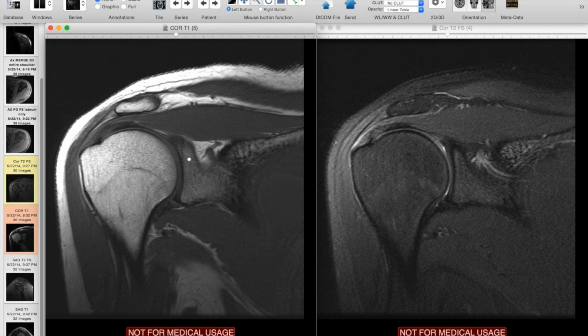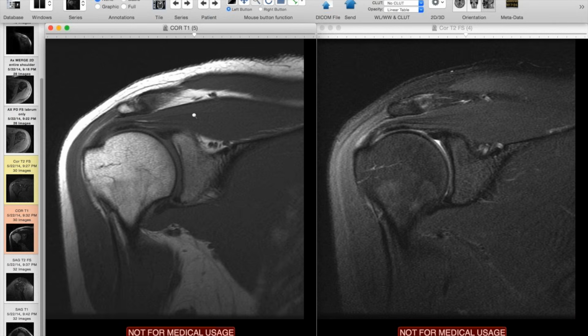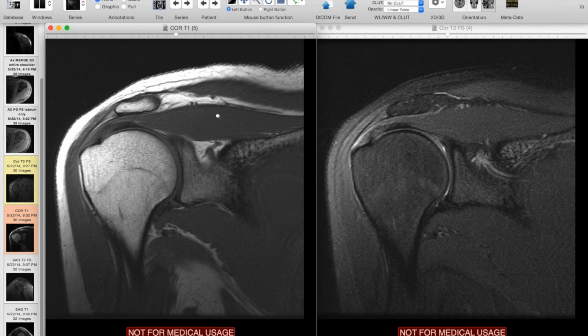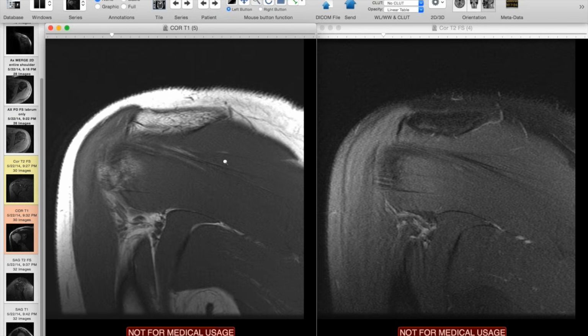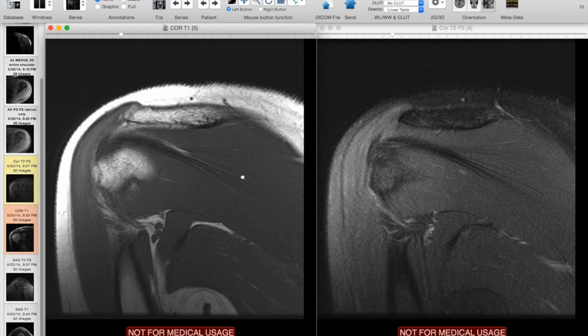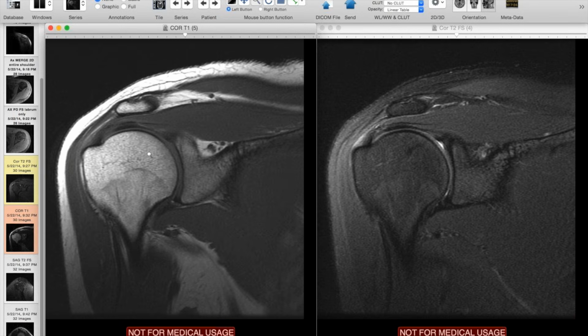Moving further posteriorly, we're going to transition between the supra and the infra. And one way to realize that you've done that is if you look at the T1 weighted images, you go between the muscle belly of the supra through a fat plane here to the next muscle, which is the infraspinatus. The infraspinatus tends to have more of a rhomboidal type shape, and the tendon on the orientation of our images tends to be coming up and over like this, so it's different than the supra, which again tends to be fairly horizontal.